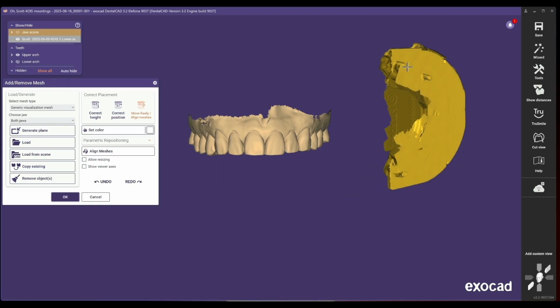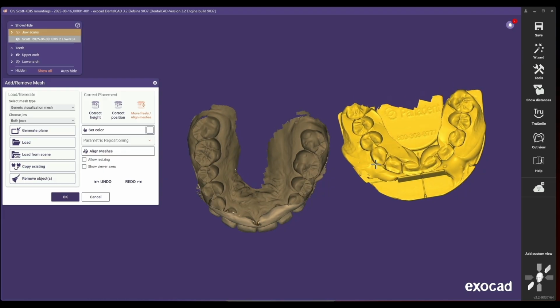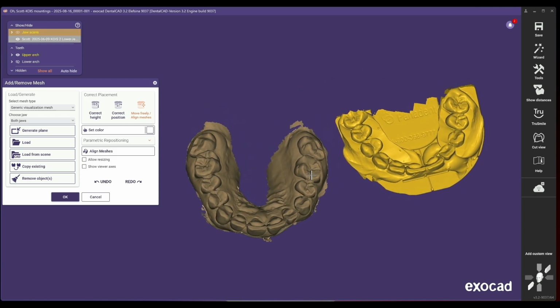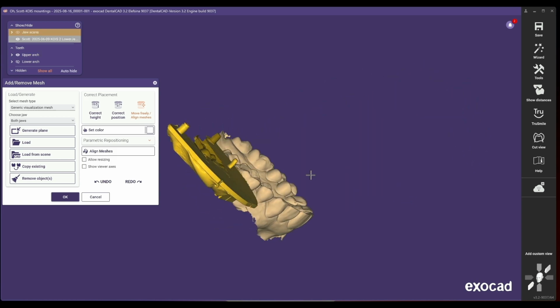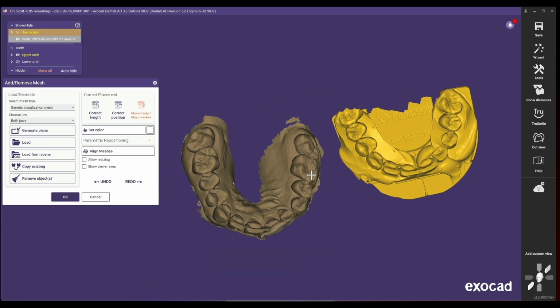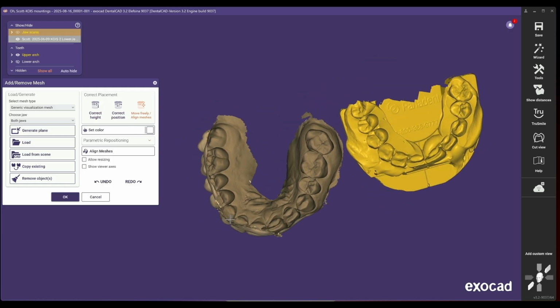Now, you can orient this either way. So essentially move this model on top. So when you look, you're going to look down through it. Okay. And now see, there's the model. It's kind of like looking down into an impression. And some people don't like that. They prefer to do it this way.